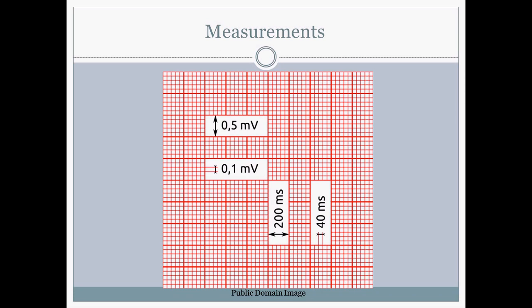If you don't know if your paper is standard, especially with practice material you find online, your rulers might not be accurate, just because the paper might not be to the proper scale. So I greatly prefer calipers. Personally, it's a little bit easier to see.